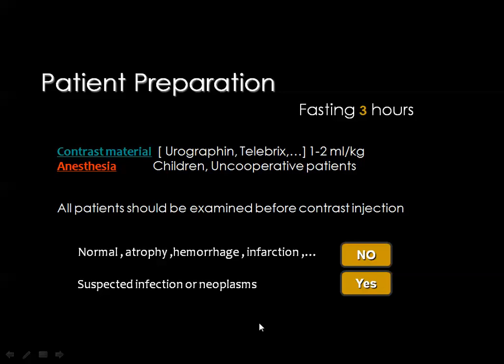As you all know, we usually evaluate the brain by CT in cases of emergencies, and I have discussed the way to assess the brain by CT scan in the lectures previously introduced about imaging of the normal adult brain and also imaging of the normal pediatric brain.